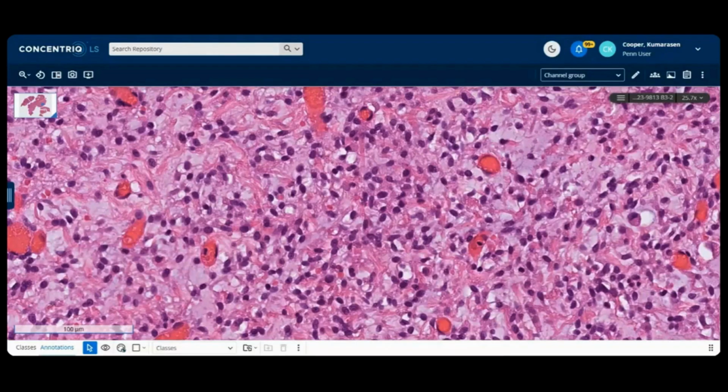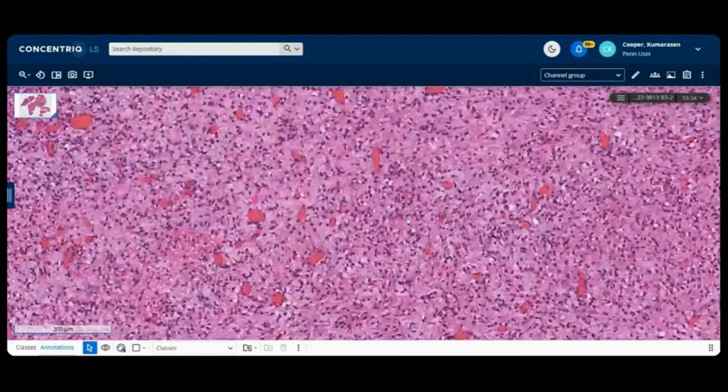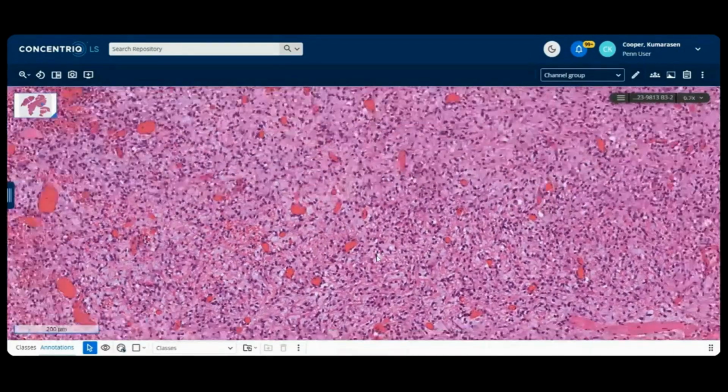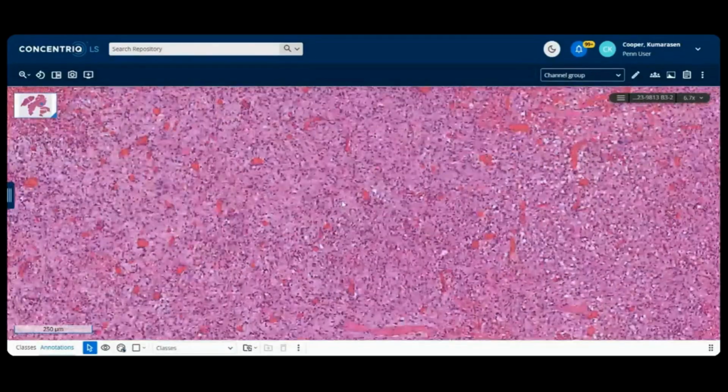nondescript capillaries. Yeah, spindle cell lipoma does have to come into that differential, Heba, because of the cellular varieties, and again, you're going to be asking yourself the question, is this a truly ropey collagen or not? And it's not easy to be sure about that. So RB1 is lost in spindle cell lipomas, and you can get some S100 immunoreactivity and CD34 as well.